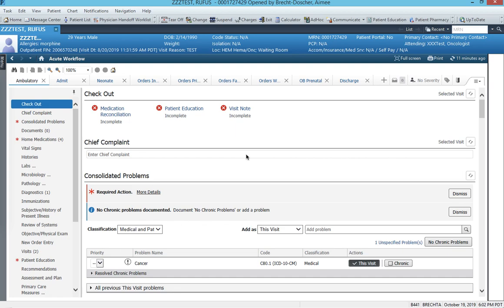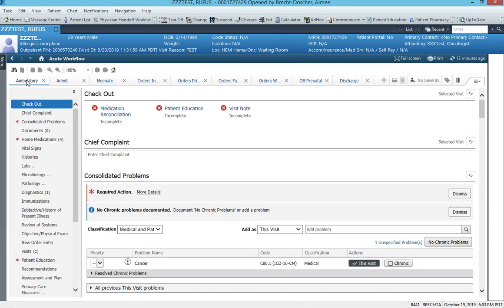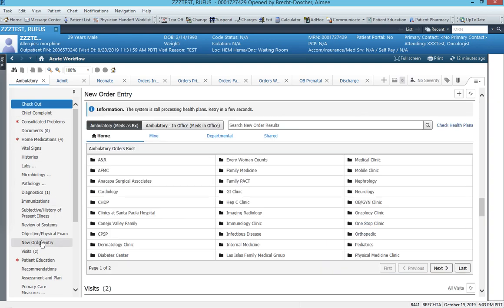In this video, we're going to go over the new CareSelect clinical decision support for advanced imaging. You'll see this for CTs, MRIs, and nuclear medicine studies. So you're going to go ahead and order however you normally order, be that from the workflow pages, from the quick orders, or from the orders tab.